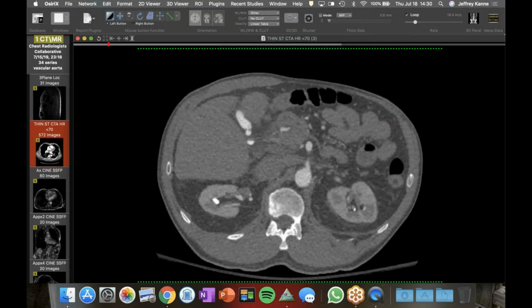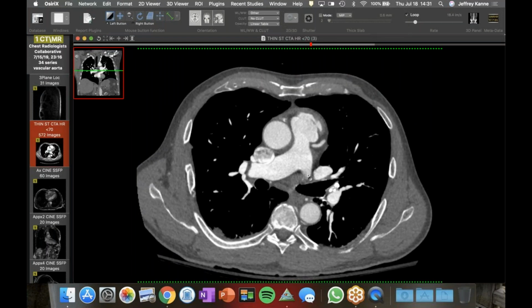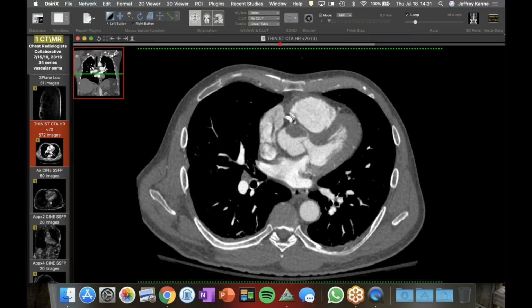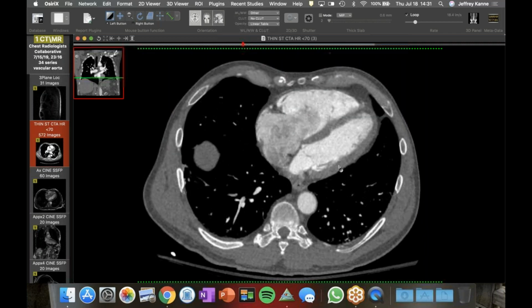Yeah, because if you looked at the amount of plaque, you can see he doesn't have a lot of plaque. He's got minimal disease in the LAD. But yeah, just and right, the fact that it's on the right side is even worse because of their pulmonary hypertension from their chronic thromboembolic disease. So yeah, that right coronary is working even harder with the RV. Yeah, look at that.